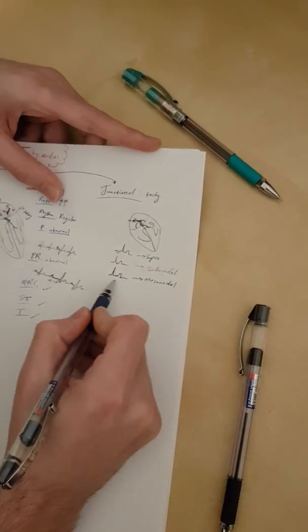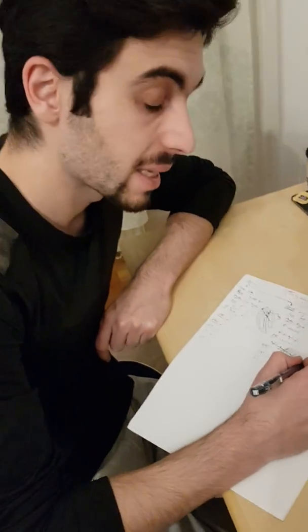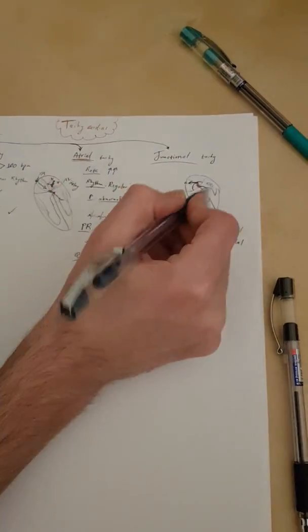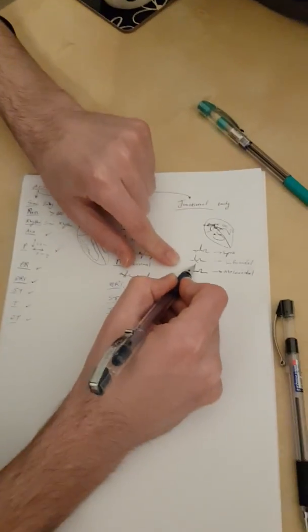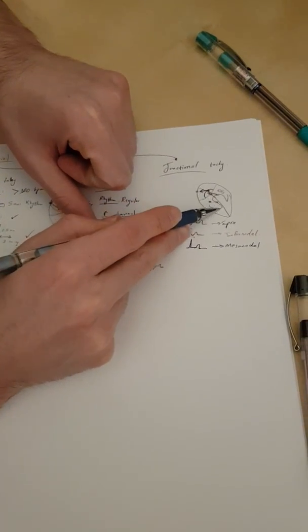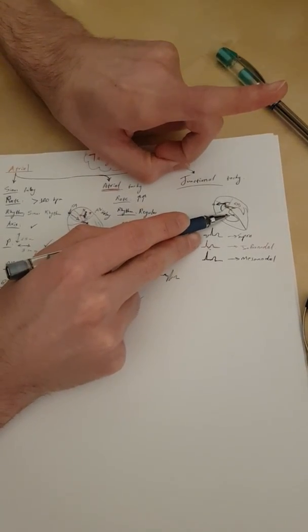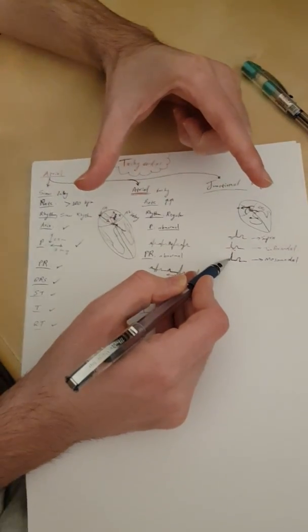Now, how do you differentiate a mesonodal from a VPC? How do you know that this is coming from a junction and then conducted downwards, or is it a VPC, like starting from here and going? First, there are two things. First, the QRS will be narrow in a mesonodal because it's being conducted through the normal pathways. So this is the first thing. While if it was a VPC, it will go cell to cell, and of course cell to cell takes longer, so the QRS will be wider. You'll see a prolonged or wide QRS.